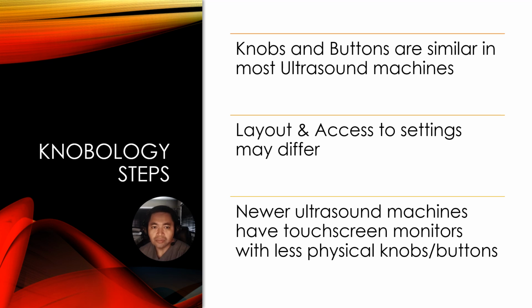In almost any ultrasound machine, the buttons and settings are very similar. Only the layout and access to these buttons are different, especially now that the newer machines offer touchscreen capabilities on their monitors with fewer physical knobs. I will try to give you visual examples of each of them.